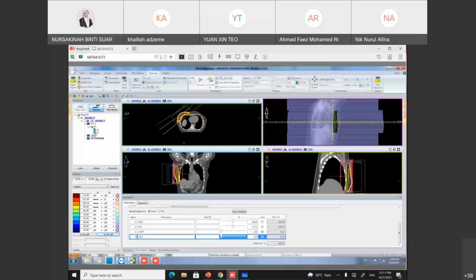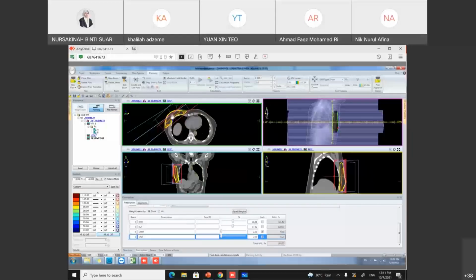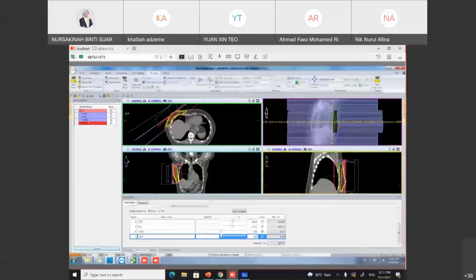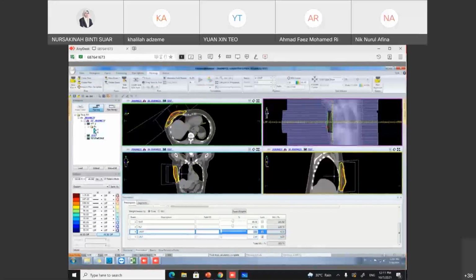Okay, now the 107% dose disappears by applying a total of 4% from the field in field technique. But as you can see at the right pane here, there is still a small spot there. The 107% is still there where it shows here. Let me turn it on. Yes, here. So we may try to increase the weighting.